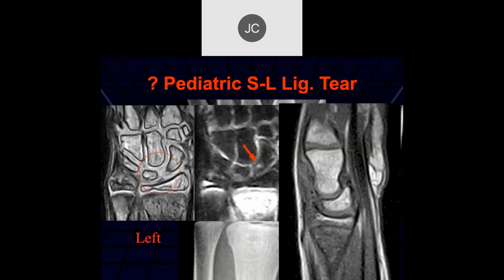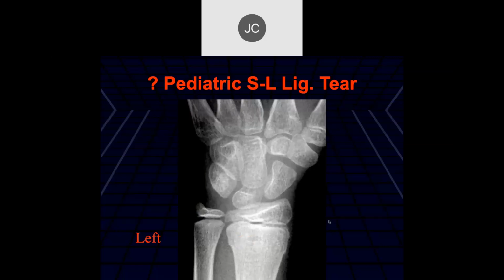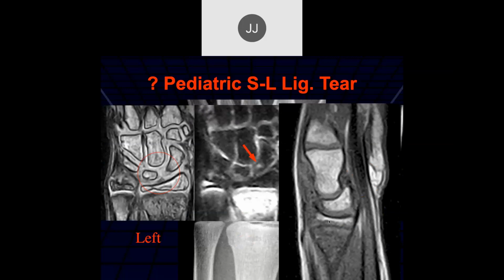And we can still see there's some volar tilt to the distal radius. Torus fracture.